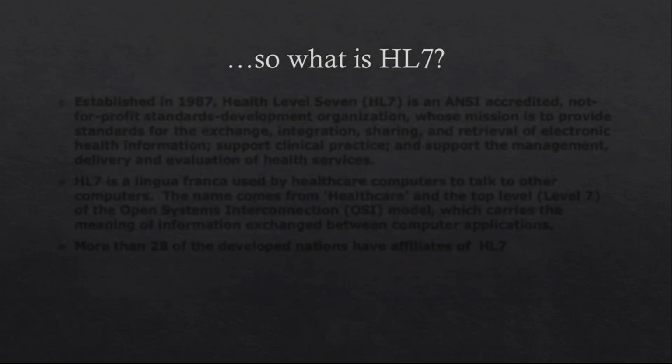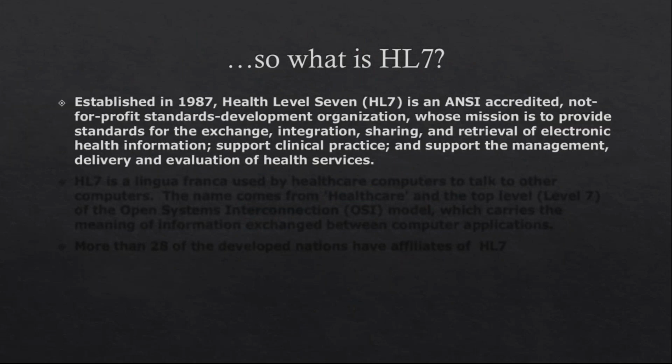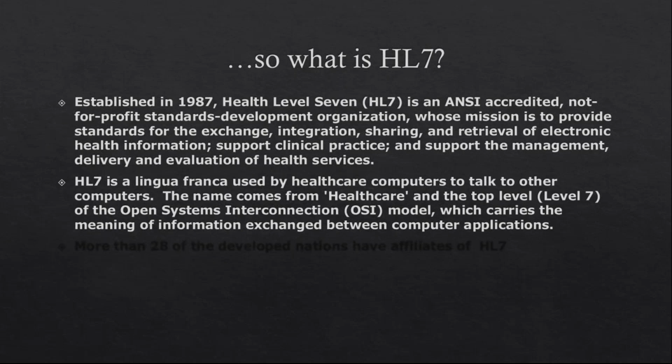So HL7 is nothing but a common medium of communication, as I said. It is used by many organizations where integration of data is the primary goal, and where data is shared between two different applications. The name itself is used very much in healthcare computers to enable two different applications to talk to each other.